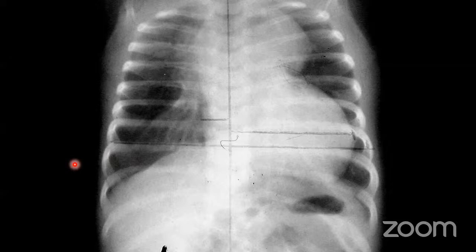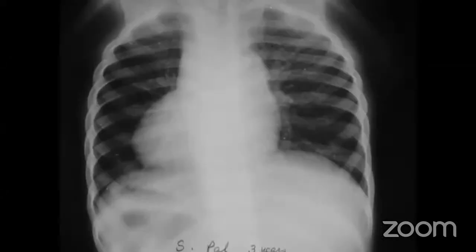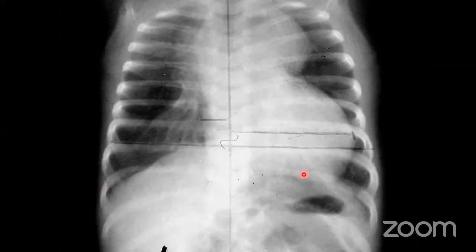But nowadays people are just changing it. They are taking possibly this maximum transthoracic diameter up to infancy. It means up to 1 year of age. The normal cardiac diameter is 0.6. It means 60% of the thoracic diameter is the cardiac diameter. And beyond infancy, if it is more than 50% of the thoracic diameter, we call it cardiomegaly.